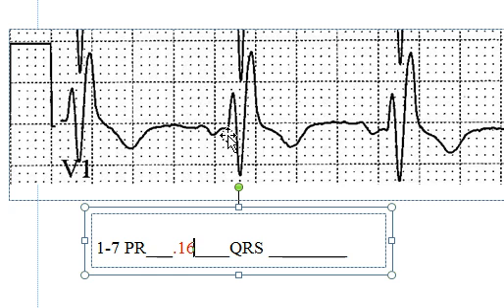So start over here and end right, I don't know, about there, which you can't see because of my little plus sign that I can't get rid of. Roughly this little box, this little box, this little box, and all of that little box. So 4, 8, 12, 16 at least. Might even be 18. I don't have calipers that I can use on this machine. So 0.16 at least, may even be more. Okay, so we have a PR and a QRS, it's the same thing.